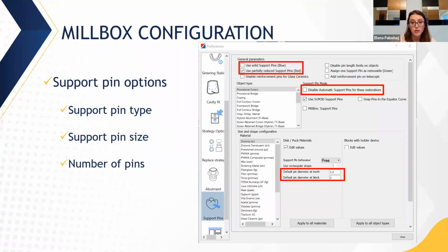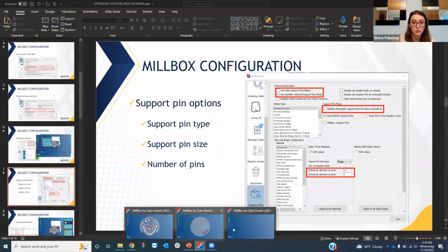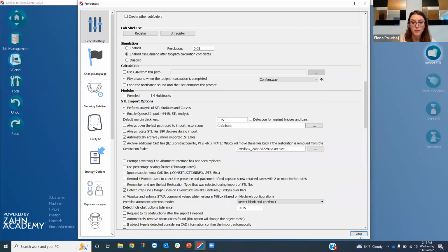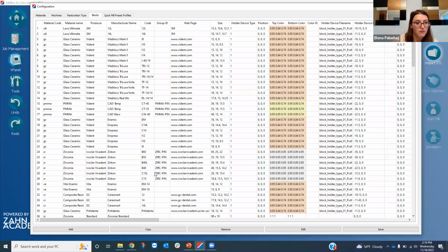Another area where this can be changed, and I'll talk about the Control D menu in a little bit more detail, is a function that's the Control key on your keyboard and the letter D. That will give you the list of the blocks that you have available.